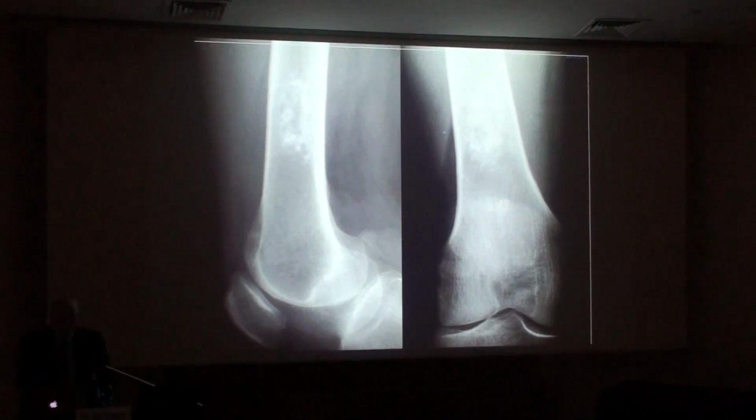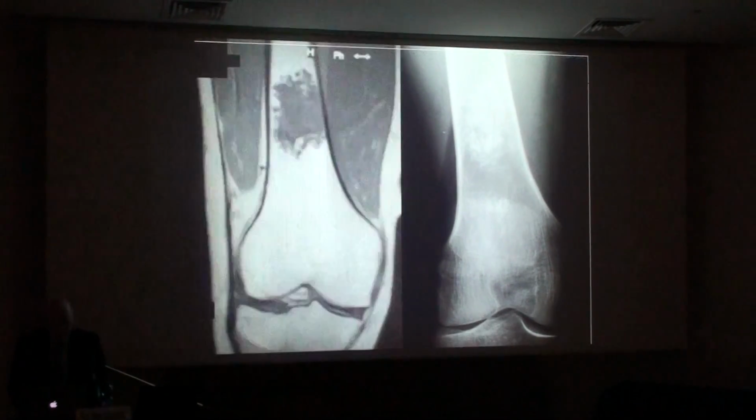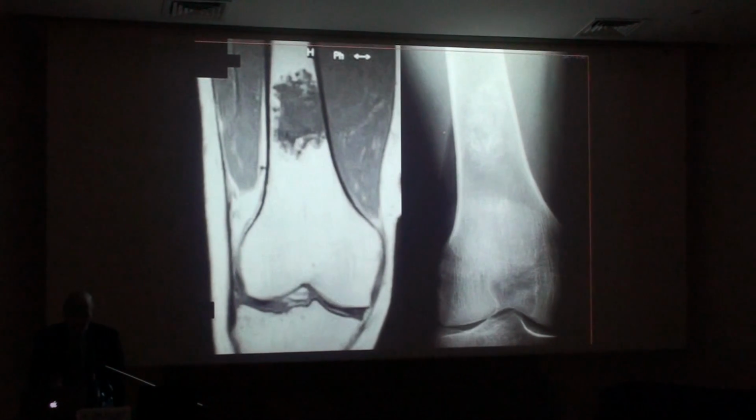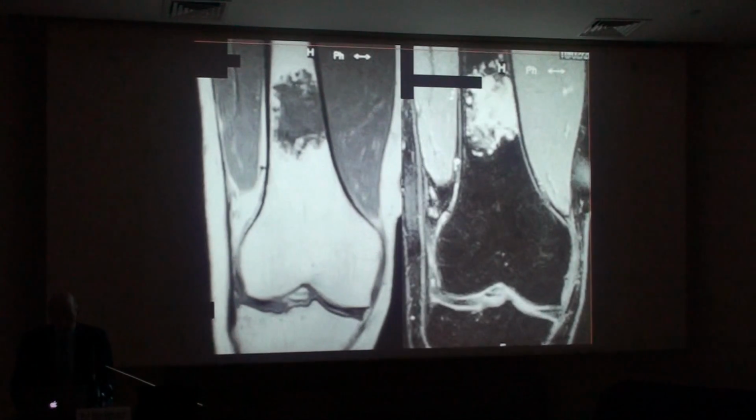Here, a cartilage lesion, beautiful cartilaginous matrix, T1 weighted image, shows the lesion coming up and pressing against the cortex, but there was no endosteal scalloping. And the way I read it out, I would call it an enchondroma. If you prefer, you could call it a cartilaginous lesion with no evidence of an aggressive biological behavior; most likely an enchondroma. And here the corresponding T2 weighted image.